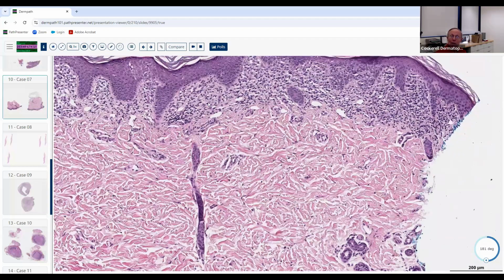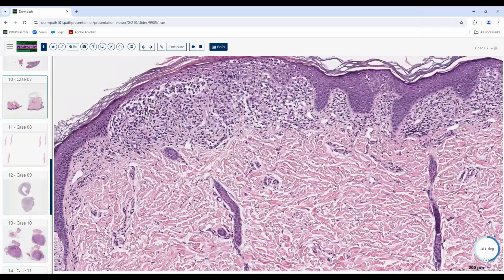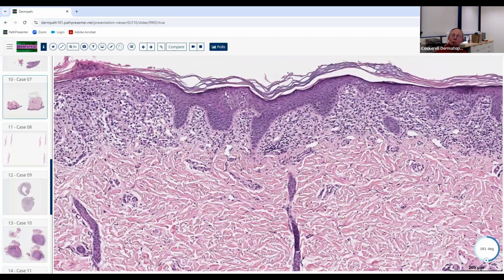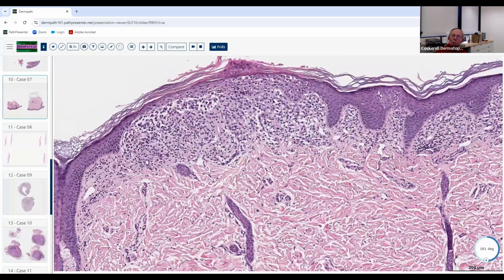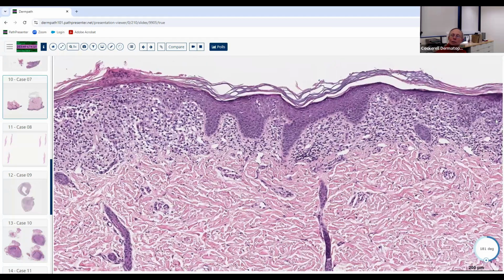You may not know. That's okay. Syphilis is one. There's a rare form of lichenoid granulomatous persistent pigmented purpuric dermatitis, rare. Lichen striatus can rarely give you this pattern. Lichen nitidus usually doesn't give you this diffuse pattern, but it's also focally lichenoid granulomatous. Granulomatous mycosis fungoides can give you this pattern. And that's about it.